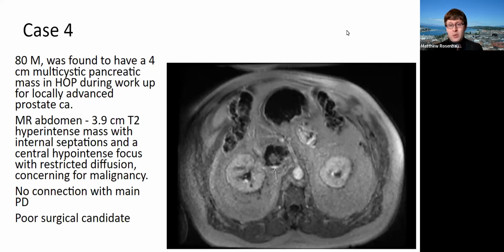So basically, they wanted to rule out cancer. This person has a lot of other issues going on, so if they can rule out cancer, they can just follow him as long as need be. So we can take a quick look at the biopsy, and I'll talk a little bit more about the cytology in a moment.